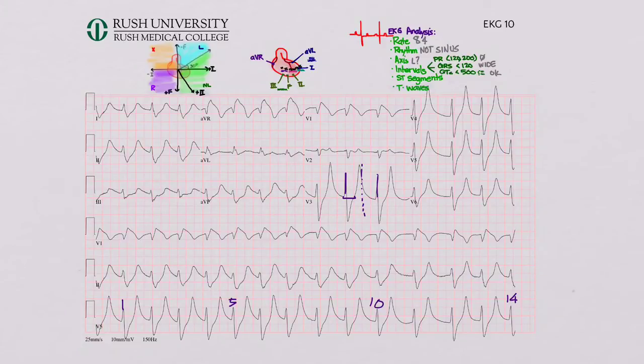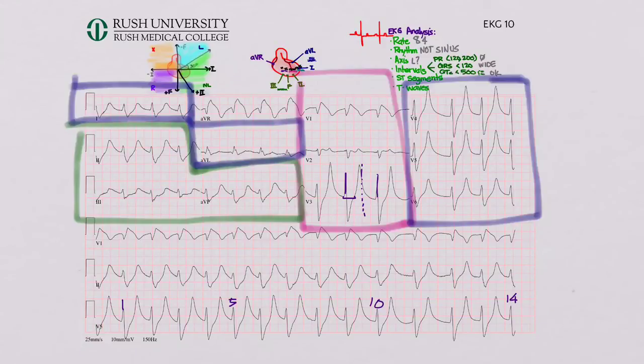Now let's look at our ST segments and our T waves. And it's challenging to say. It looks like in each one of these leads, the QRS is wide, the T is wide, right? You never see T waves that are this wide, and they're tall. And so this widened QRS, widened T, tall T's, that's characteristic for hyperkalemia. And so this is one that we need to know, that you should be able to pick up this kind of wide wave from it.